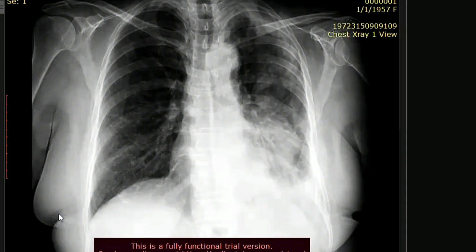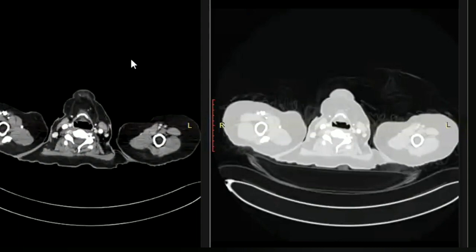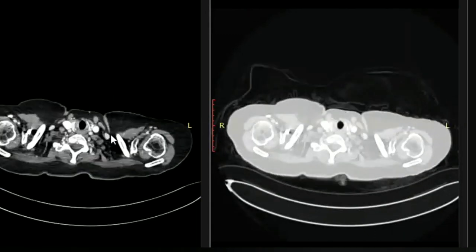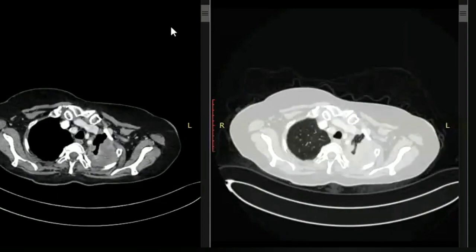Yeah, very nice description and very nice differential diagnosis. I have a CT scan, so I will show you the CT images. First of all, I will scroll mediastinal windows and then lung windows. You can always request me for a second review if you think I was fast. So first you concentrate on the mediastinal window and then later on the lung window, right?